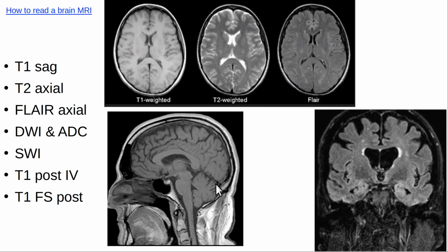Okay, the only difference between a brain MRI in a man and a woman is that a premenopausal female will have a big pituitary. The top of her pituitary will be convex on its upper margin because of their menstrual cycle, okay? Other than that, male and female brains look the same, okay? Somebody might write a paper claiming some subtle difference, but in terms of looking at them, and I've seen hundreds of thousands of them, that's the only thing that jumps out at you.